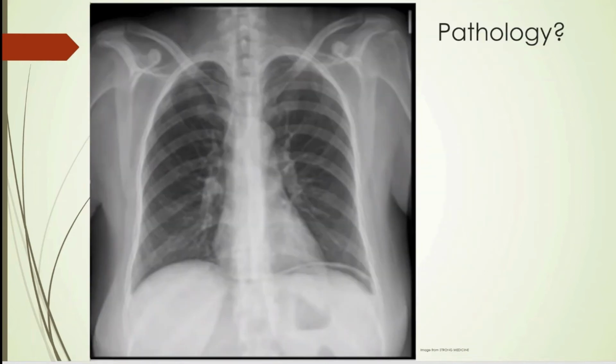Let's start off doing A for airway. Here's your airway. You see it bifurcates. Looks like the carina is going to be right about here. B for bones. Bones all look pretty good. Clavicles look alright. I don't see much in the shoulders. Vertebrae you can see, and they are looking okay, the ones you can see anyway. And C for cardiac silhouette, it's looking okay.